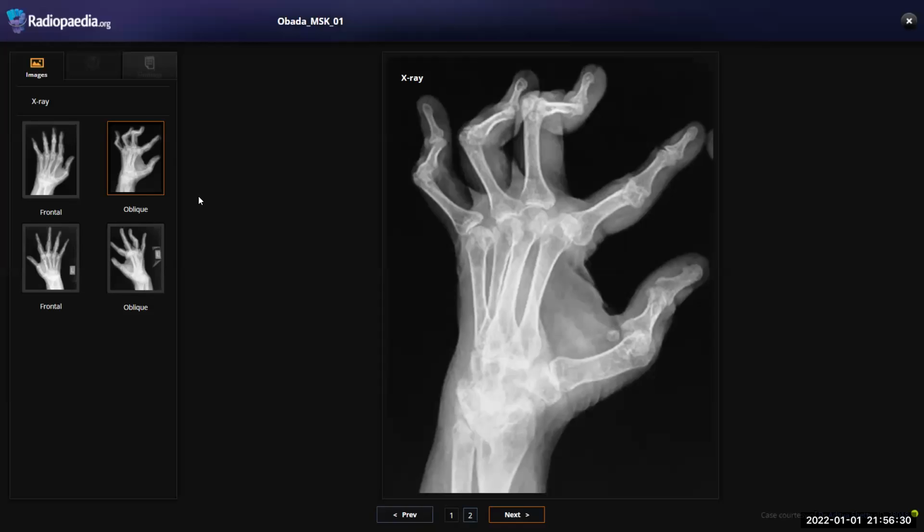Okay, why do you think it's not psoriatic arthritis? What's about the distribution you don't like? Psoriatic arthritis has more involvement of distal and proximal interphalangeal joints. There is predominantly new bone formation, and it can also cause pencil in cup deformity. And I cannot see any of these abnormalities in these joints, and also there is less involvement of the intercarpal and radiocarpal joints.